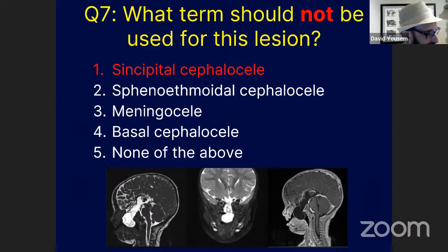And this was indeed a congenital cephalocele. Now the term cephalocele is kind of indistinct. Usually we want to know whether the cephalocele contains meninges and fluid and/or brain tissue. So depending upon whether you think this is purely meninges and fluid, you might use the term meningocele. If you think that there is indeed brain tissue, gray matter that's herniating through as well, you would use the term encephalocele. And if it's the meninges, the fluid, and the brain tissue, we would use the term meningoencephalocele. The sloppy or lazy term would just be cephalocele, in which you're not making that distinction.